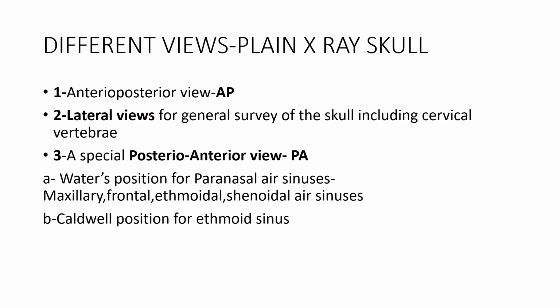AP views are good, but because of the higher amount of radiation exposure to the nose and the eyes, this is avoided, and basically done for cervical vertebrae and fracture of skull. The lateral view is for general survey of skull including the cervical vertebrae. In the posterior anterior view, there are two positions which we use, that is Waters position and Caldwell's position.